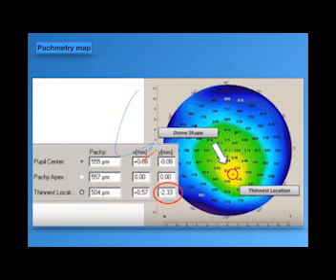Compare the four figures, and you can consider this patient suspicious if you find that the difference between the pachymetry maps, for example, is more than 15 micron in both eyes. Okay.